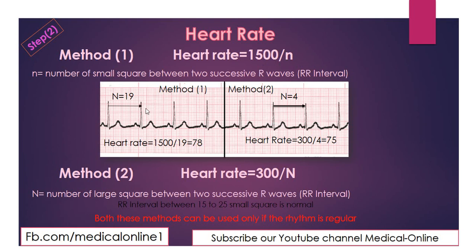Remember, this is small n. 1500 divided by small n, and this is for regular rhythm. Small n is the number of small squares between two successive R waves, or the RR interval. I calculated this. n is equal to 19, so the heart rate will be very simple: 1500 divided by 19 comes out to 78.